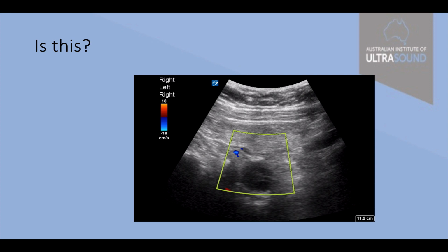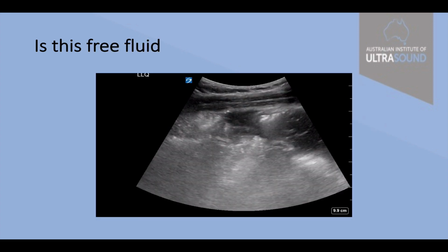Oh, that's another one to give you a break. It's bounded, isn't it? So probably not free fluid. Can't even guarantee that it's fluid on a still.